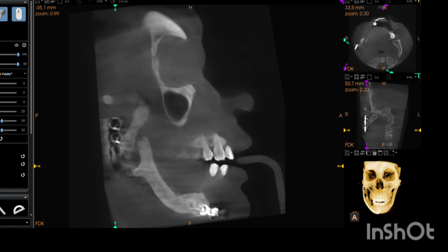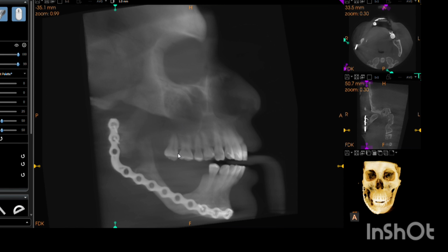Now, talking about the reconstruction plate, the screws at the posterior mandible, that is in the molar region, are normally integrated or attached. However, if you have a look at the screws of the reconstruction plate along the ramus, the screws appear detached, or separated from the bone, because of the fracture which has taken place. Now, the inferior fragment, which we can see by the cursor, is in continuation with the remaining body of the mandible. And the upper fragment, the superior one, has moved above.